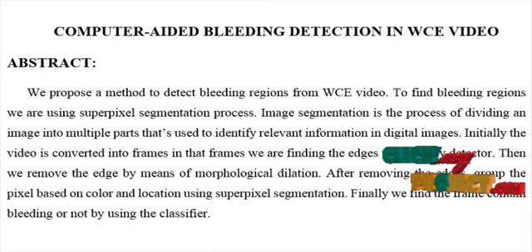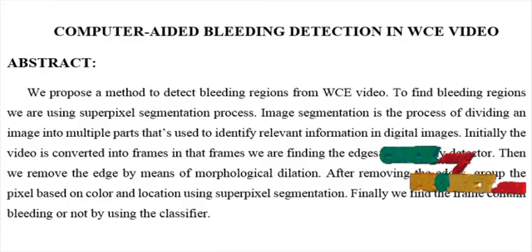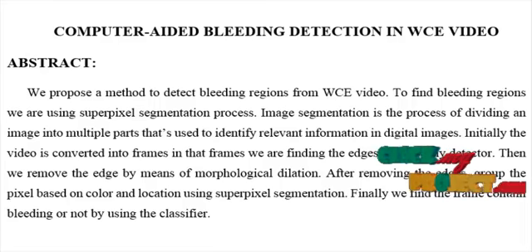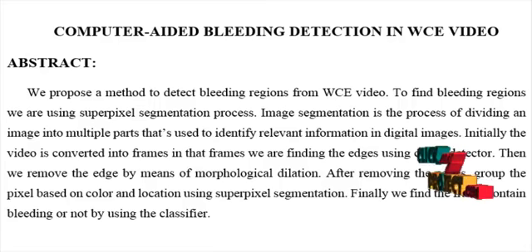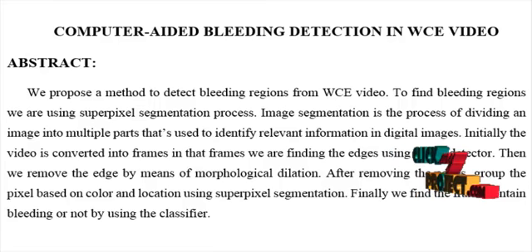In the edge detection process, the first derivative in the x and y position of the pixels is obtained. The edge detection angle is rounded to one of the four angles representing vertical, diagonal, and horizontal components. Dilation operation uses a structuring element for probing and expanding the shapes contained in the input images. The image is dilated, then the coordinate points known as the structuring elements were employed for the dilation process.